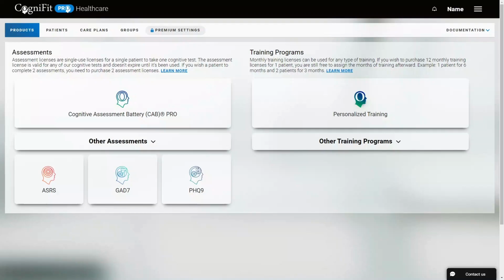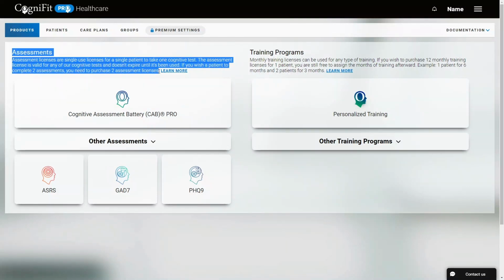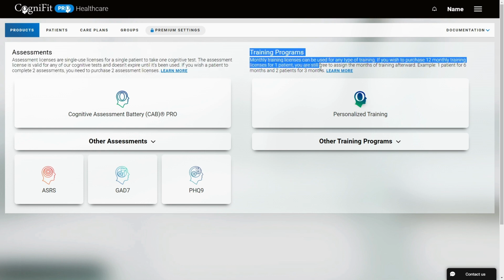Hello. In this video, we'll learn how to use licenses in the Cognifit Healthcare Professionals platform. As we saw in the video on how to use the Healthcare Professionals platform, Cognifit offers two main types of products: assessment batteries and training programs. If you want more information about these products, we recommend you watch that video. To use assessments or training programs, it's necessary to have the corresponding licenses.